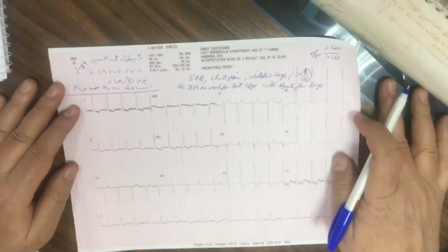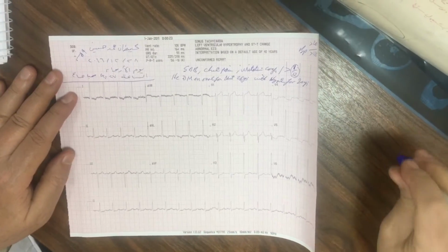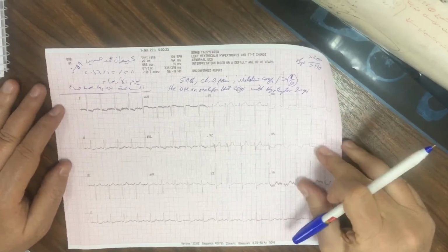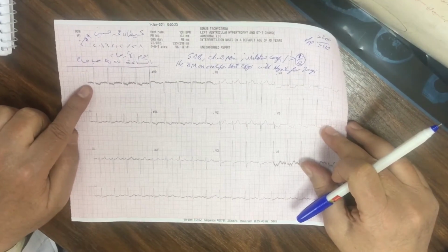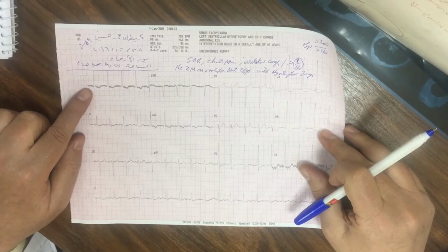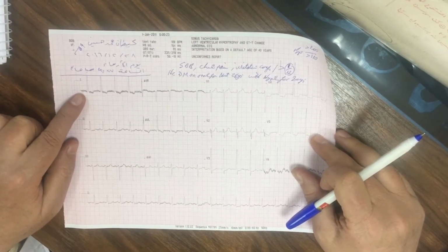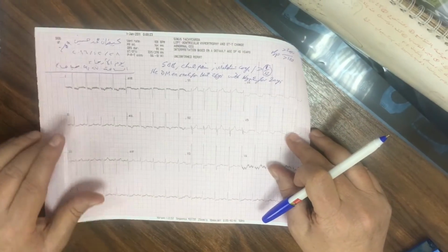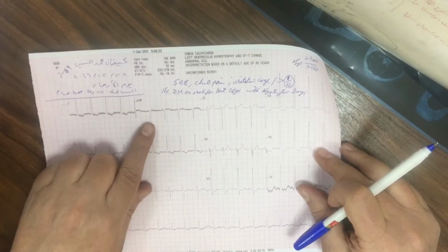This is his ECG. His ECG, pay attention. First of all, we look for the connection, if it's wrong or not. I mean by connection wrong, putting the right in the left and the left in the right, okay? And it is connected normally.